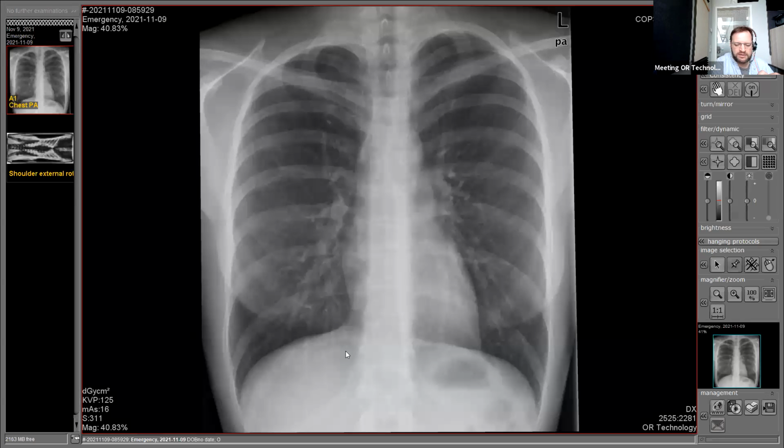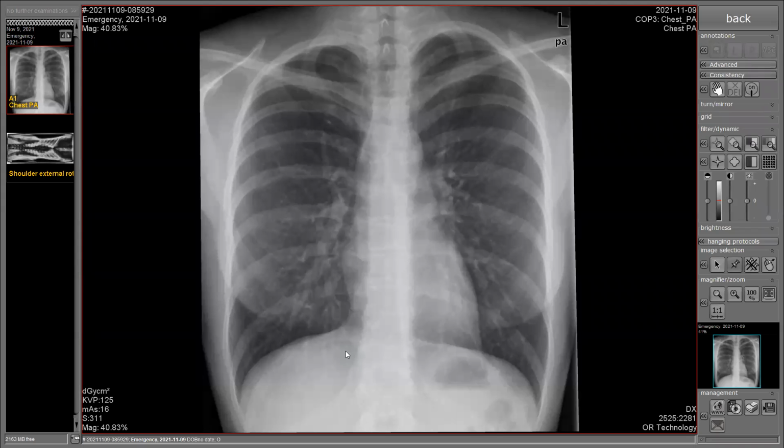You mean this one? You see the data information in the four corners on the image. Yeah. Okay. Can we change it to follow the design of the doctor before print?